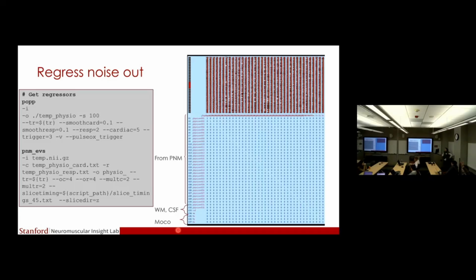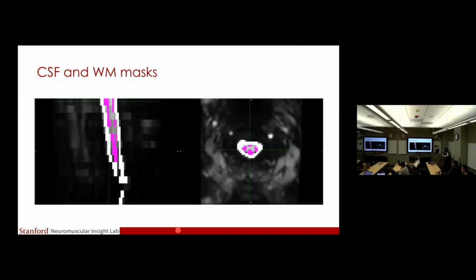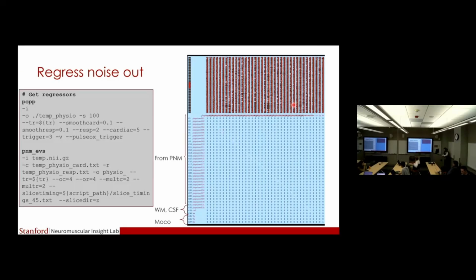So yes, that's fine. How do you include the white matter? So basically, after bringing the PAM50 template to the native space, I see the white matter in the native space, and then I can extract the signal over the whole white matter, or if I want to do it slice-wise, for each slice, and then add it as a text file in the FSL regression.